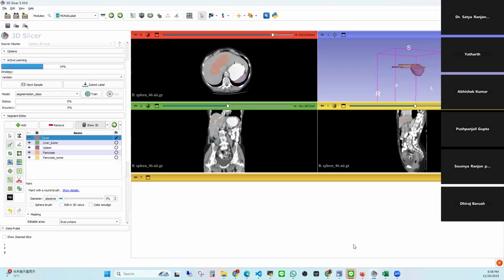Yeah. So like this one, I just annotate one slice and then I just move. If I accidentally skip another and just move to the other slice, then when you view this in 3D Slicer, you can see there is some gap between two annotations. So this will help you know you are missing some slices, and you keep on annotating in a proper way and then you get the proper annotation. So this is how you annotate using this Segment Editor.